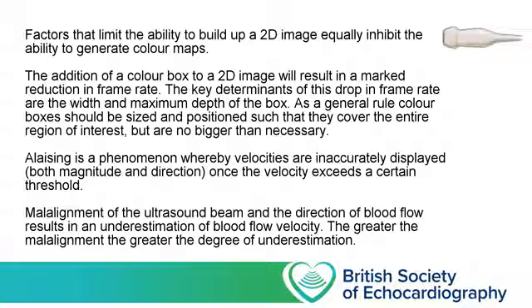Putting these last two limitations together, I'd recommend that you don't use colour Doppler to estimate velocity within the heart, but rather to get a general impression of the volume of blood flowing, direction of travel and timing within the cardiac cycle.